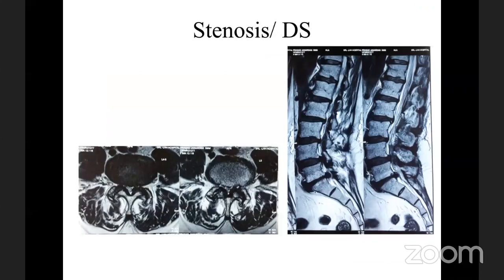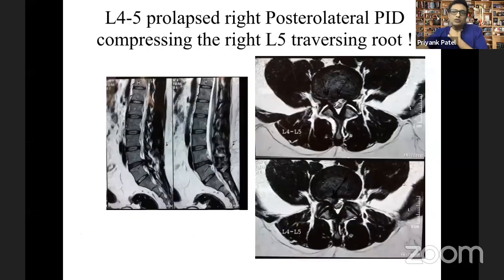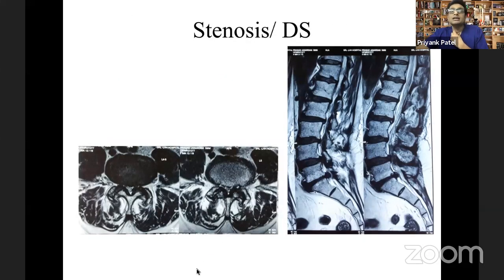From a clean prolapsed intervertebral disc, you go back to lumbar canal stenosis. The first thing that tells you it's lumbar canal stenosis is you see a dirty looking MRI, which means all the bones are looking funny, degenerated. All the discs are looking black. Multiple discs are bulged. One more thing you notice here, which is different, is that behind the cord there is nothing white, it's all black.